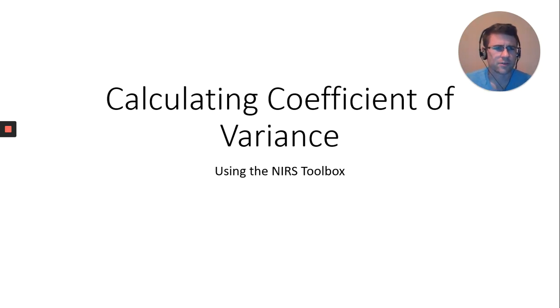Hello everyone, this is a quick video on how to implement a coefficient of variance in the NIRS Toolbox or Brain Analyzer toolbox. If you've ever used NIRS Lab, there's a step called data quality check or check data quality. It basically implements a very quick and easy to use coefficient of variance across all channels for a single subject.